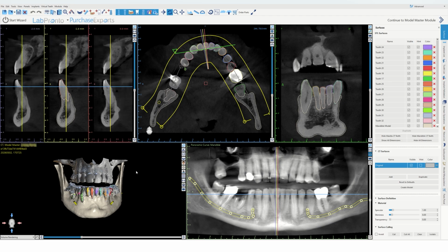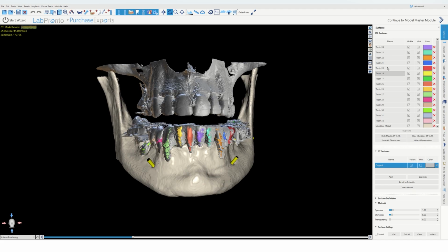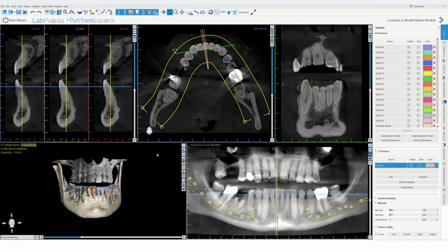All right, so we've already segmented out the mandible. Why did we bother doing that? We bothered doing that so that we can get rid of this cone beam, which is ugly and not very useful. What did the mandibular segmentation accomplish? It rendered a mandibular bony model from the cone beam CT. Emphasis on bony model.